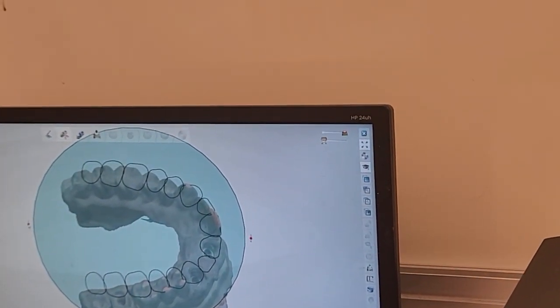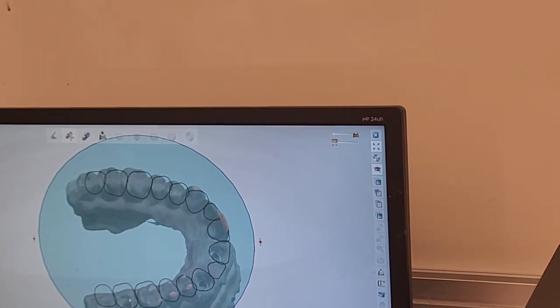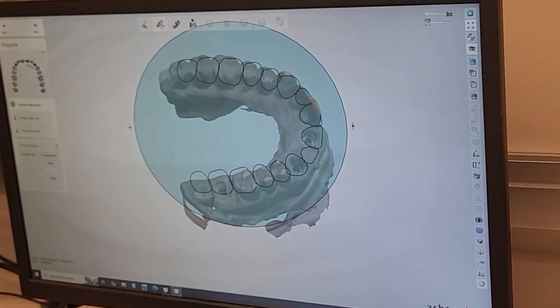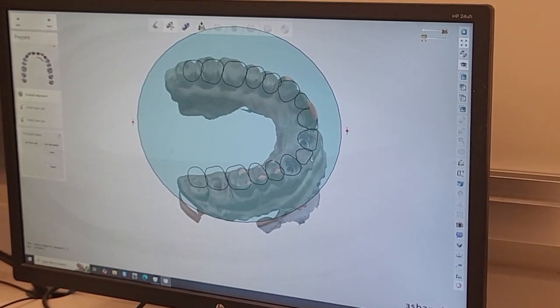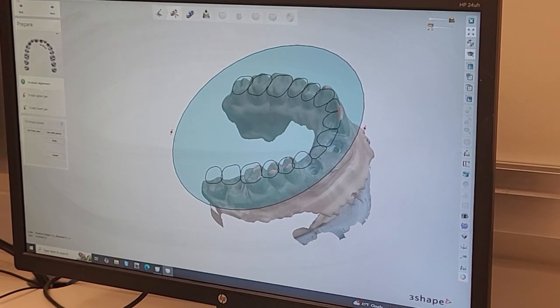It's not gonna be always very accurate and fitted correctly over all the teeth, like here, but sometimes the jaw in the back could be a little more wide open or narrower. The most important thing is to match where your restoration is. So here it looks good to me.